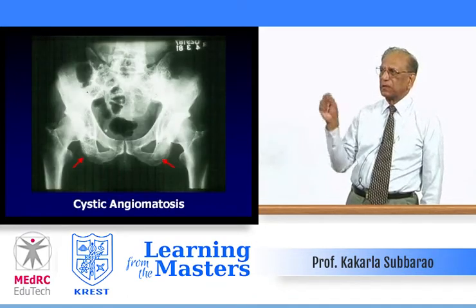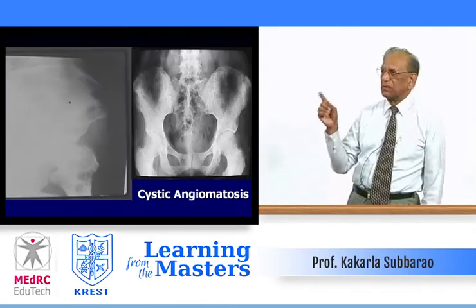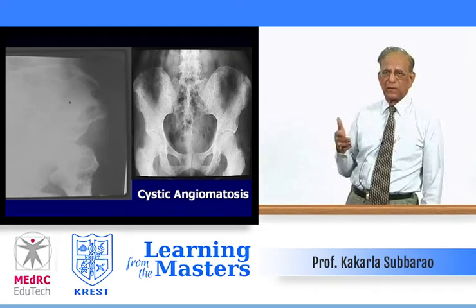Multiple lucent areas depicted in the ischia and iliac bones. Another case of multiple lytic areas. The one on your left side shows huge areas of lysis, indicating metastasis or myeloma. That form is rather rare.